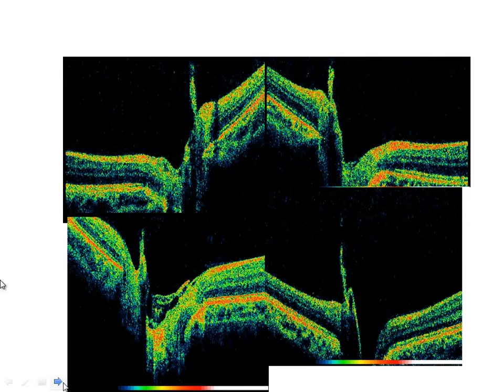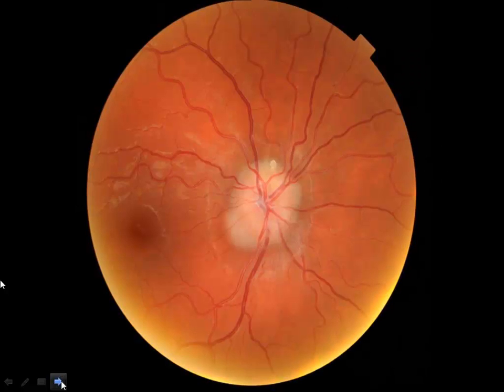Other things that occur at the level of the optic nerve head, as we're showing over here, this is actually something that's very common, and about 73% of patients have this. It's just a congenital anomaly, Bergmeister's papilla, if you will, coming out of the disc. Clinically, you don't see this. I've looked at 50 students of mine, 100 eyes, found it in 73 eyes, 73 out of 100 with spectral domain OCT, and I couldn't see a single one clinically. So clearly it's below the resolution of the direct ophthalmoscope.